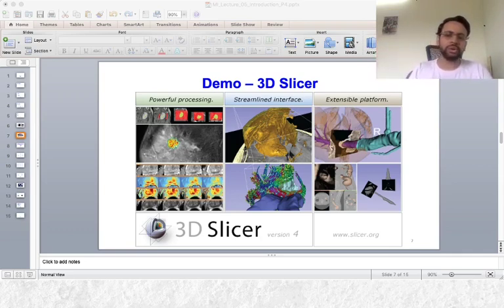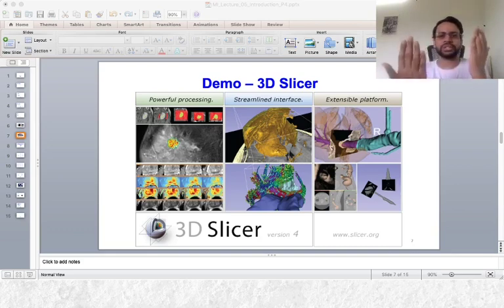That's also a very good tool if you are going to deal with visualization aspects, creating the meshes and surfaces. Again, from the same company Kitware, ParaView. This is again very good for visualizations. I used this tool earlier for visualizing the 3D deformation fields once you are registering one image to the other.